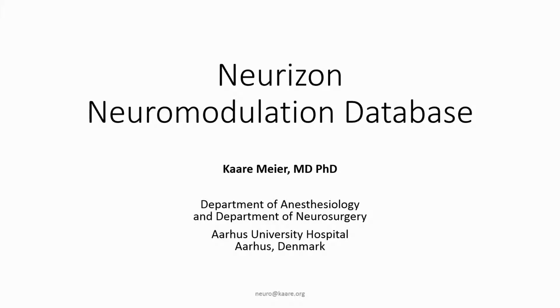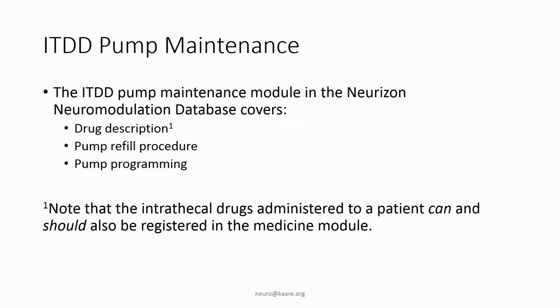This video will cover the details of the intrathecal drug delivery pump maintenance module in the Neurizon Neuromodulation database. The ITDD pump maintenance module covers both descriptions of the drugs used, the actual pump refill procedure, and the pump programming details. It should be noted that the intrathecal drugs administered to a patient can and should also be registered in the medicine module.